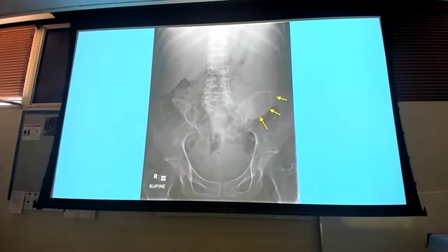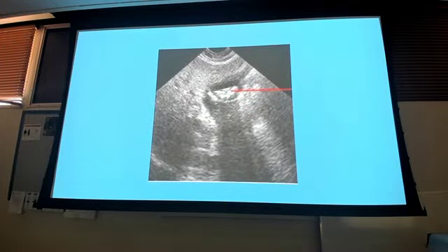What's this condition? Splenomegaly. Good stuff. Yellow arrow sign, but still coming down fast. It's well through. Okay. Ooh, what the heck is going on here? Gallstones, right? It's the only one I gave you an ultrasound on. They're not nice and round like the one we saw, but I got my posterior acoustic shadowing there. And so that tells me that there's gallstones there.